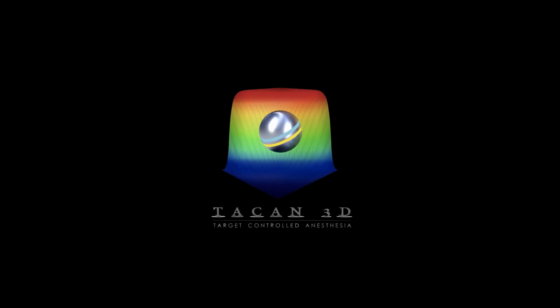TACAN3D.com tutorial, part two. We will show how to access the application and the basic steps for using the controls in the TACAN 3D software.